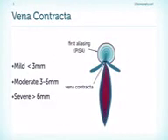So this again shows you a regurgitant jet and also where we would measure the vena contracta. If the vena contracta is below 3 millimeters or even not visible, we would quantify regurgitation as mild. If it's between 3 to 6 millimeters, moderate. And if it's above 6 millimeters, we can be quite sure that regurgitation is severe. Now this all looks very appealing. However, in clinical practice, it's sometimes much more difficult and there are a number of problems. Let's take a look at the problems.